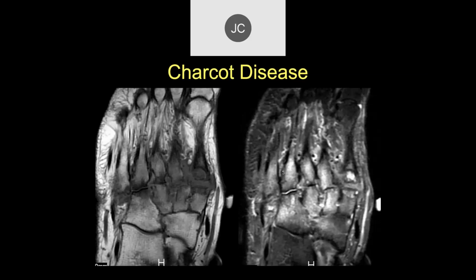What's kind of interesting here is that the metatarsal tarsal arch is involved, the entire arch, all the way across here. Not one or two, but the whole shebang, which is more common in Charcot disease than osteomyelitis. It just depends on the extent of the osteomyelitis; usually the infection affects one or two, but by then treatment is started.